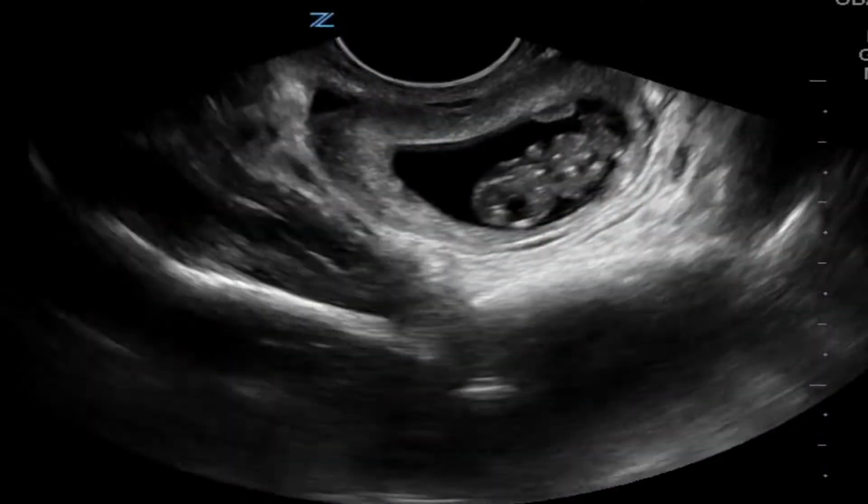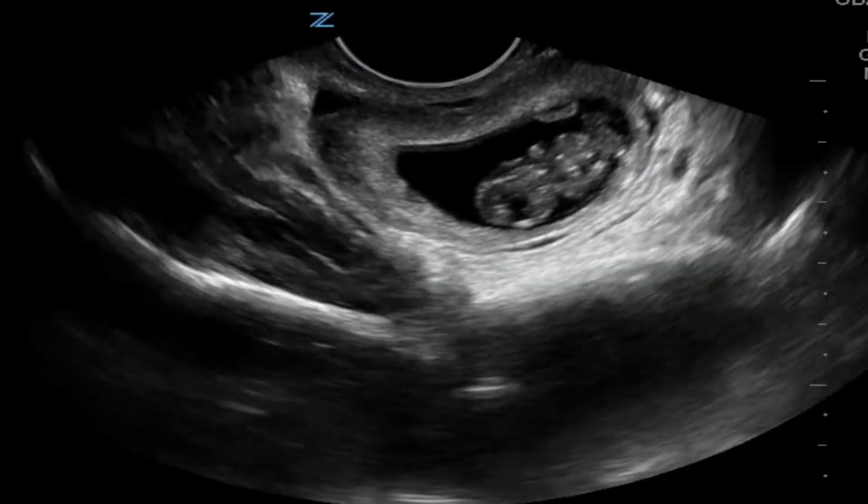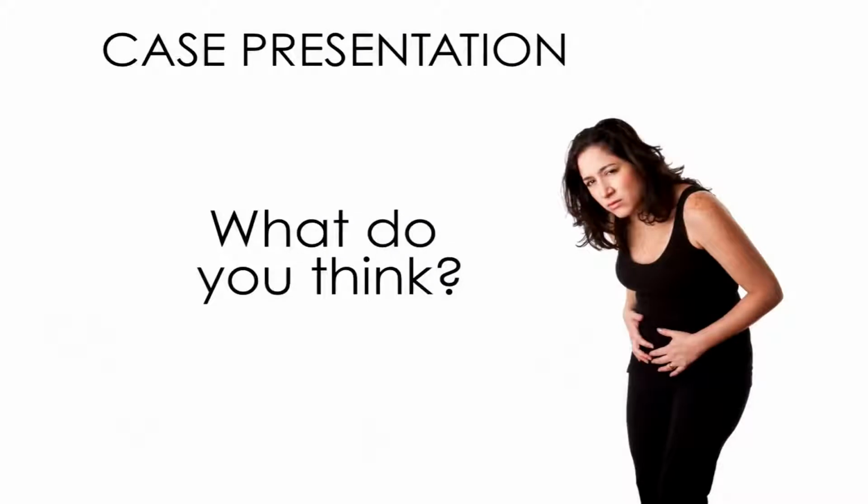This is her transvaginal ultrasound. So, what do you think? We will return to this case at the end of the module to see how it turns out.